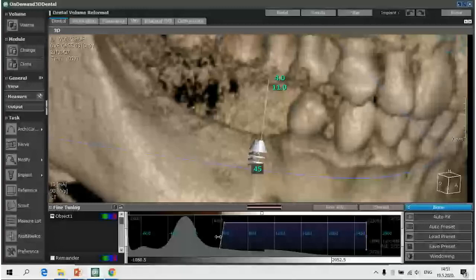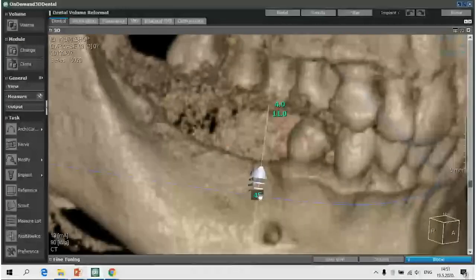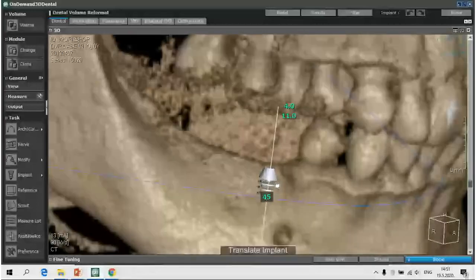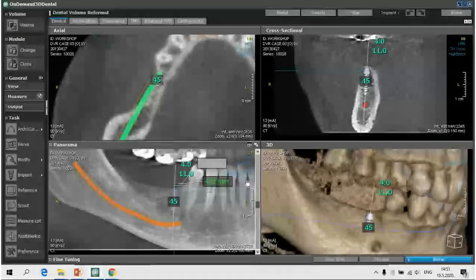So we will need to increase the sensitivity in the 3D reconstruction. But these parts are also evident here, and radiological data cannot be changed as much as 3D data.